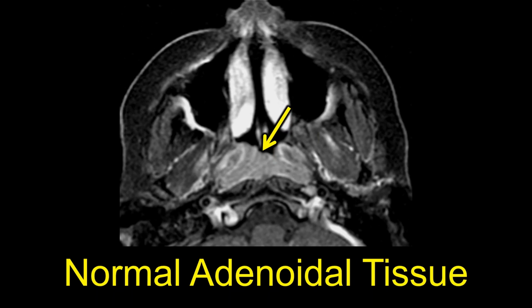ring, the ring of adenoidal tissue that's around the upper digestive tract. So we have the base of tongue, lingual adenoidal tissue, we have the palatine tonsils on both sides, and we have the nasopharyngeal tissues up high. So that makes a ring of adenoidal tissue around the upper digestive tract, with the base of tongue, the palatine tonsils, and the nasopharynx up high. That's called Waldeyer's ring often.